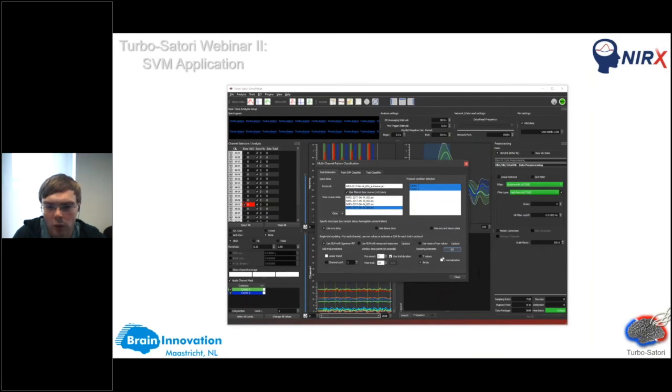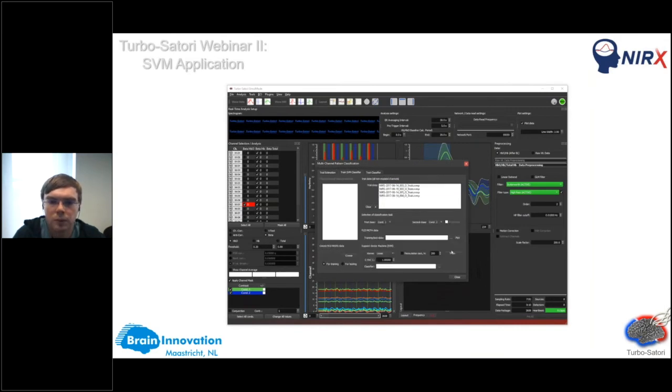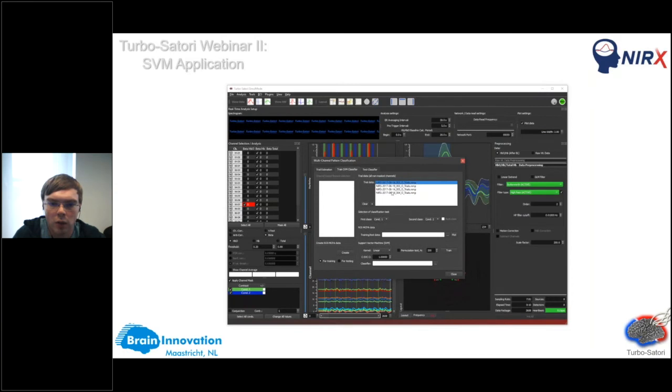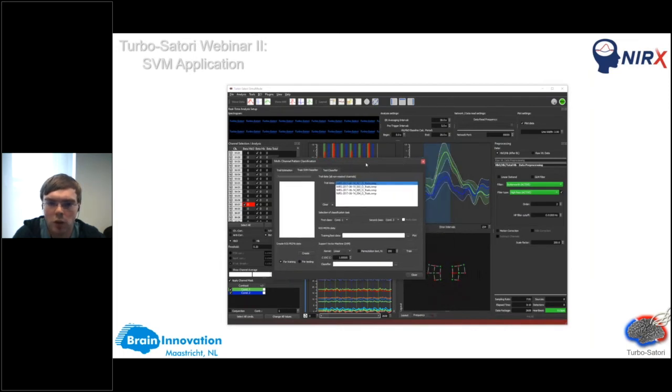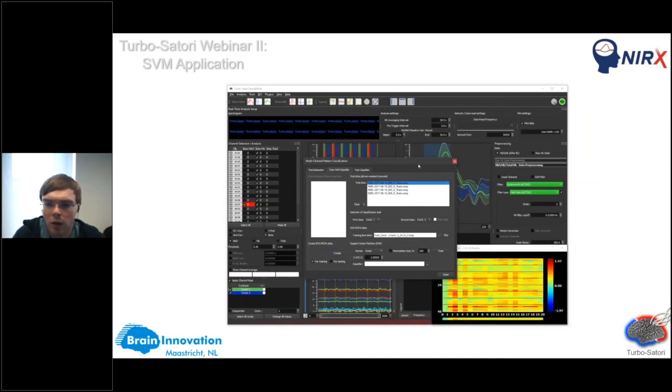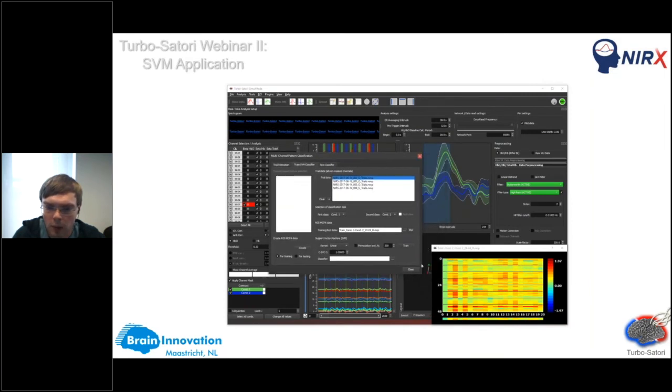If you have decided on what you want to do, you just press go. And then all the trial data, so each of these individual blocks, are extracted and available here in these plots. This includes all the non-masked channels, so all the channels that you see here. In this case, we have 20 channels. So to create our training data, you can just press create and look at the data over here. I will go into this plot after the training, just to show you this later on.